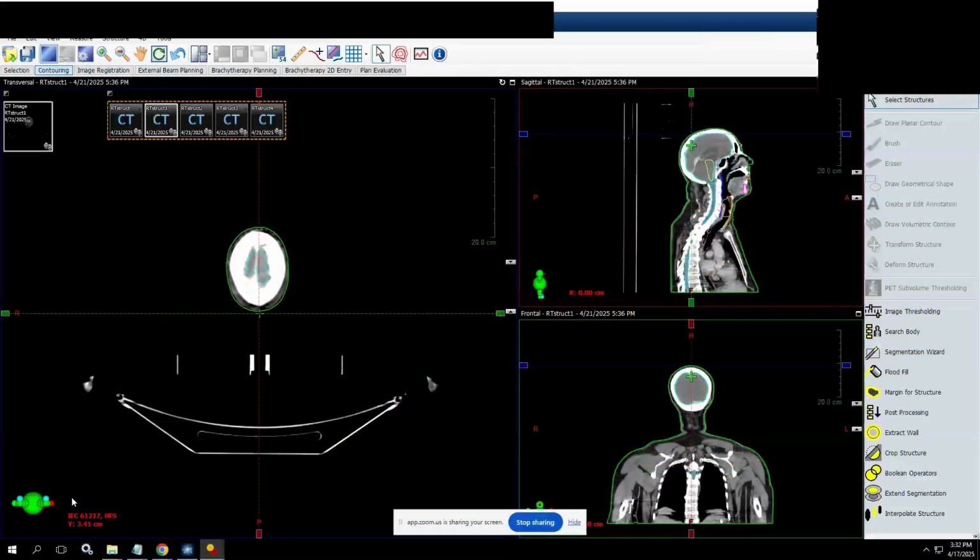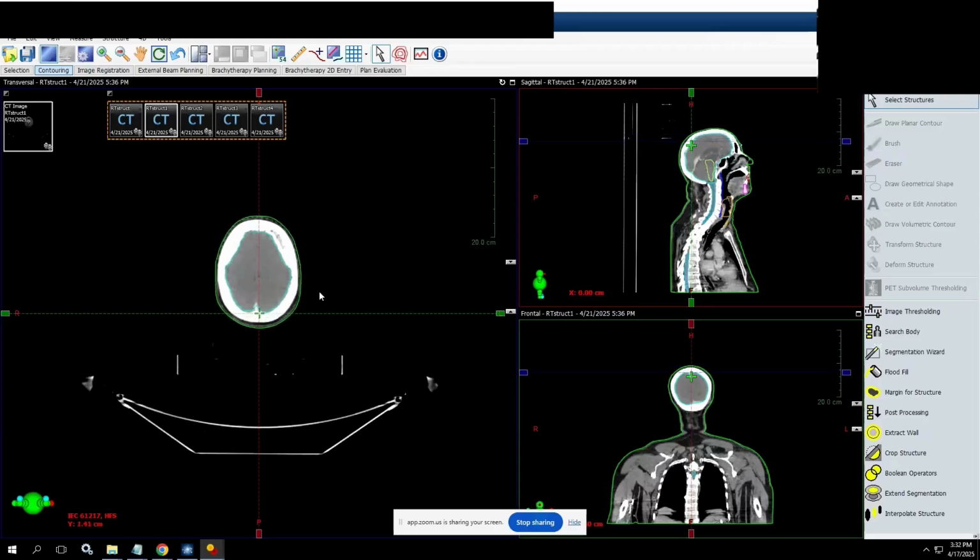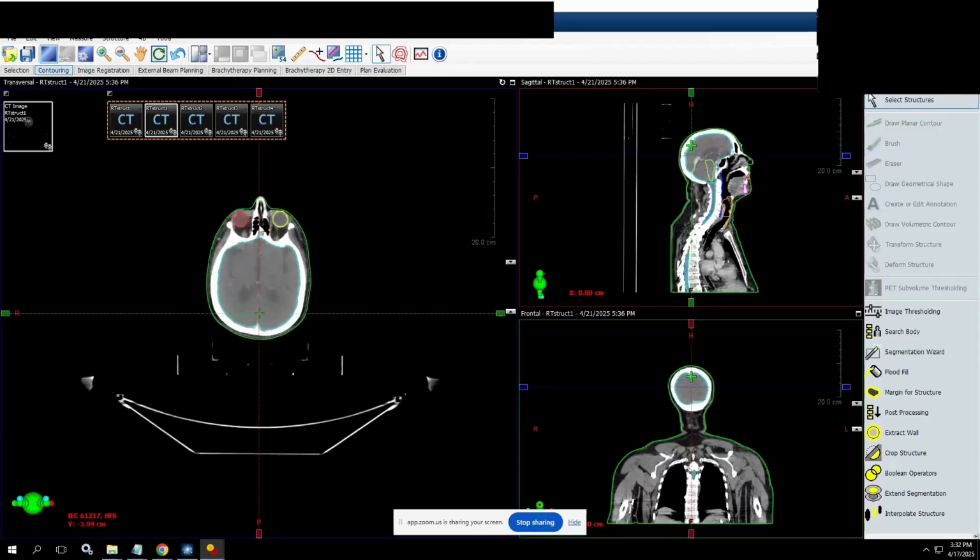In this demonstration, we will see how the nnU-Net models perform as far as the segmentation is concerned. We are giving a visual overview, as you can see the model quantitative metrics on our website. In addition, when you select a model, quantitative metrics like the dice similarity index, the median Hausdorff distance, and the over-contouring and under-contouring distance metrics are also available.